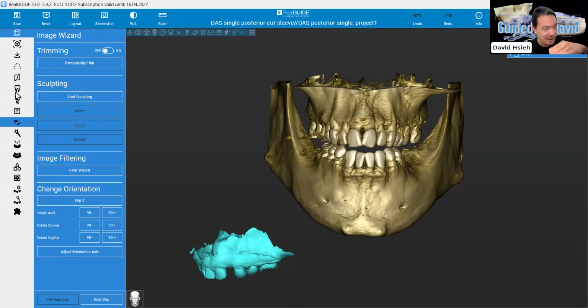Just follow, that's the workflow. All right. So rather than the workflow, you can see somewhere here that's called the object column. This is where everything, the implant, the STL file, or the tooth, shows up. And then there will be tools and items on top of this column. Based on different workflows, you will see those tools changing, right? So we can just follow the flow, and here's the control panel, and then we just use the function on top of it.